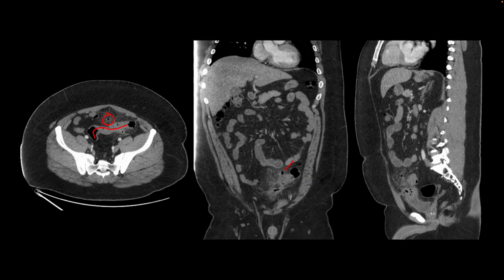Also, as we pay attention to these images, we find that that's the urinary bladder. It's abutting a part of the inflamed colon, and we see foci of air and abnormal enhancement where this loop of bowel abuts the superior wall of the urinary bladder. And we know that a fistulous communication between the colon and the urinary bladder is a common complication of diverticulitis, and this patient is probably going to develop that soon if this condition is not treated. So impending colovesical fistula from diverticulitis.